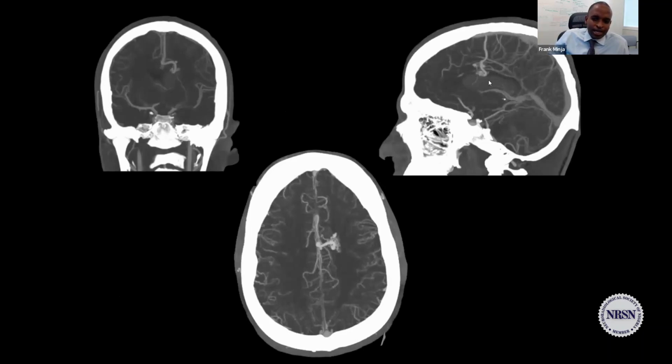Remember, again, the lesion is not in the dural venous sinus. So what are we talking about here? What do you guys want to say? What caused the hemorrhage? Team, what do you want to say? We don't know the source. We need to go to an angiogram.